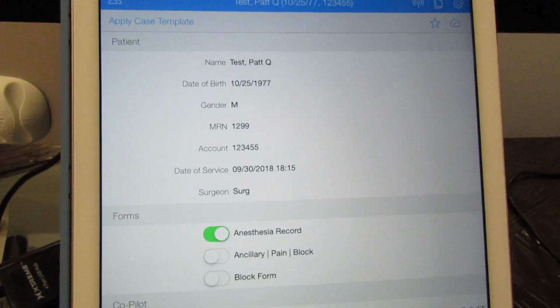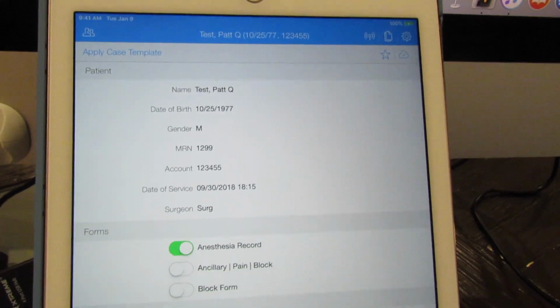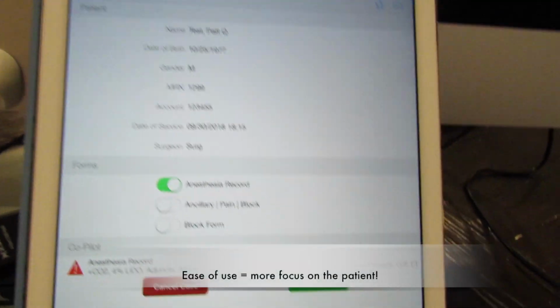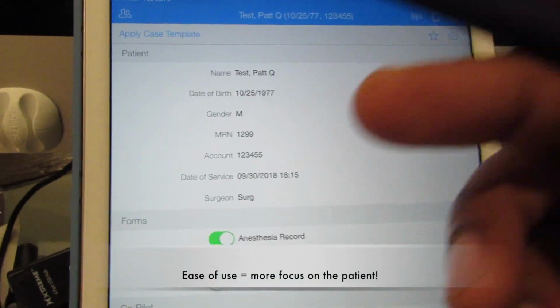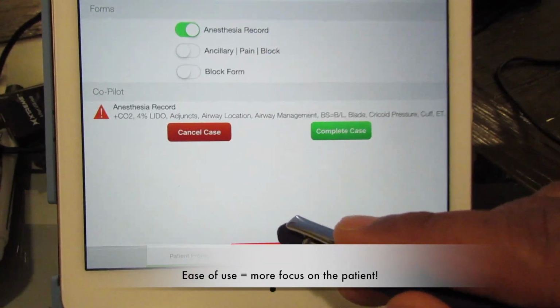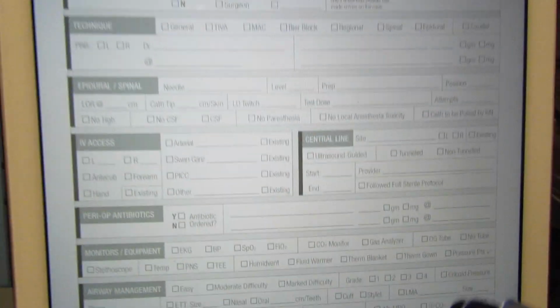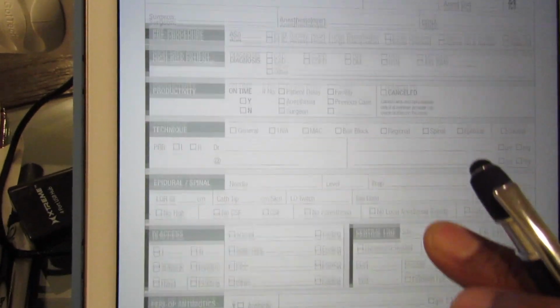Let me show you just how incredibly easy this thing is to use. So intuitive, takes only about a minute or so to really train a locums on it, all via touchscreen, of course. This is where you'd encounter your patient, and let's start a pretty quick case. Let's say an EGD, for example, page 1, where all the pertinent information has to be done, signatures and everything.